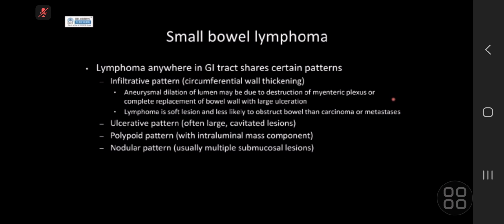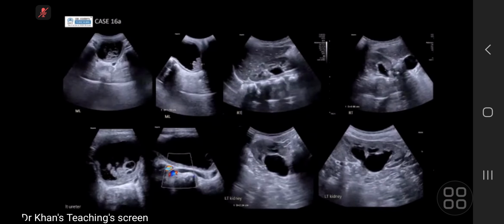It doesn't change from what I've mentioned earlier in the previous head and neck lymphoma, but I just thought it was a nice picture to include of small bowel lymphoma with aneurysmal dilatation. And with the main things you think of in GI cancers, are you thinking more of adenocarcinoma? But often this happens a bit in adults unless they've got underlying polyposis or underlying syndromes, and these ones are usually more focal wall thickening with luminal narrowing and obstruction. And this kid didn't present with signs of bowel obstruction. Okay. Next case.